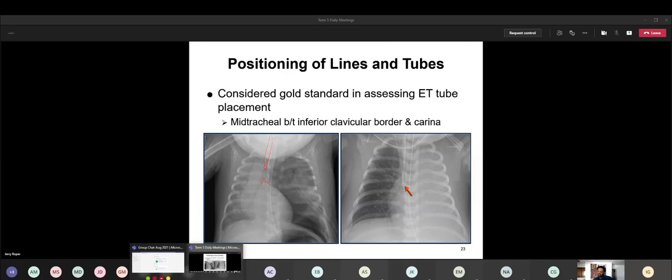And just looking at what I can see from the rest of the image at the top, like the head, all I can really see is that this looks to be maybe the chin. Is that the chin or is that the chin? I don't know. But either way, this could be one of those cases where you're going to have to pull the ET tube back until it's right between the clavicles again, or just below the clavicles.